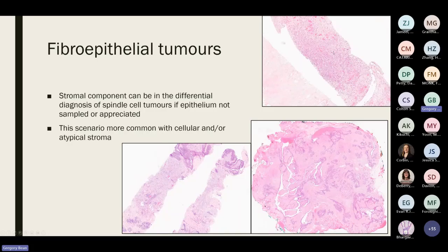Other times you'll have core biopsies where you have this high-grade malignancy with necrosis, no epithelium to evaluate, you do your stains, they are not informative, and you just have to sign it out descriptively as a high-grade malignancy, and sometimes you can't favor a metaplastic carcinoma or a high-grade phyllodes tumor. It's less likely some sort of sarcoma that can occur elsewhere in the body.